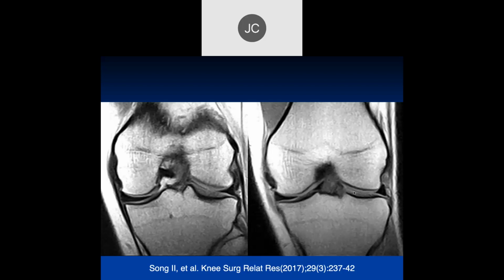So, Elior, what do you think of this case? So here we see, I think again, the lateral meniscus extends too far anteriorly, or I mean medially, and it might be right here? That's the lateral. Okay, I was looking at the other side, maybe medial. Okay. So this is actually an abnormally large medial meniscus.